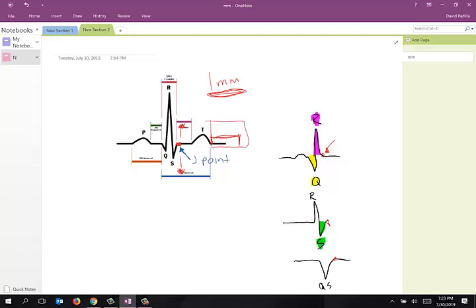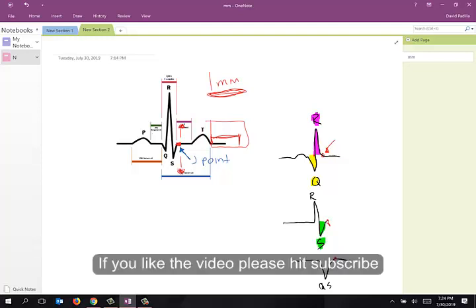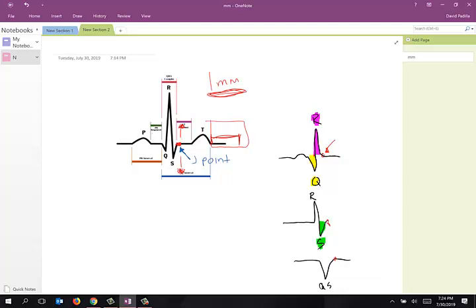So when we're initially looking at an EKG and we're wondering if there's the potential for an infarct, if patient's having chest pain and we want to look at it as a pre-hospital professional, we're paramedics out in the field, we take our 12-lead EKG, we're going to look for ST elevation. The way we do that, we're going to find J point, the area where the S wave turns back towards isoelectric, plus 40 milliseconds, one box, and then compare that section to our TP section. If it's elevated 1 millimeter or greater to that, we're going to consider it significant, and we're going to keep looking for the other indicators.